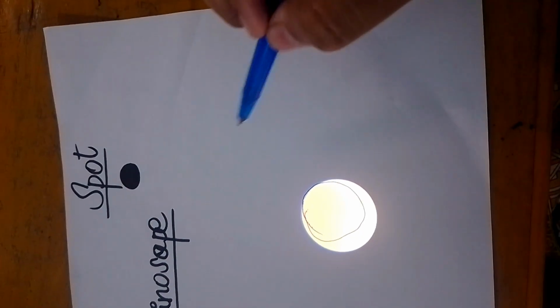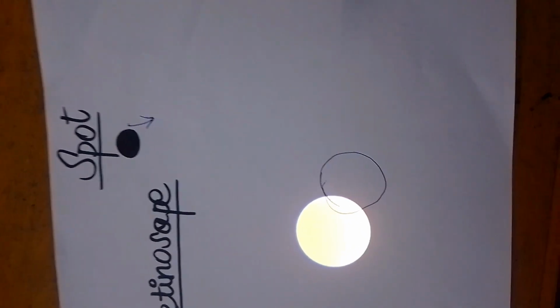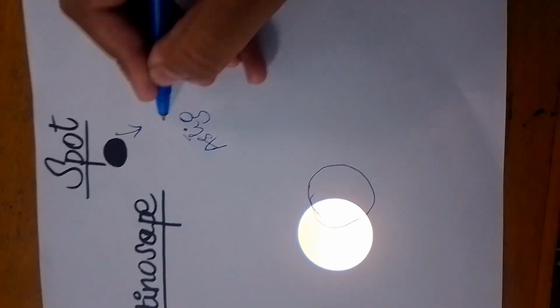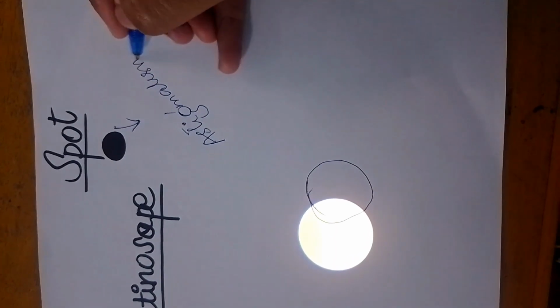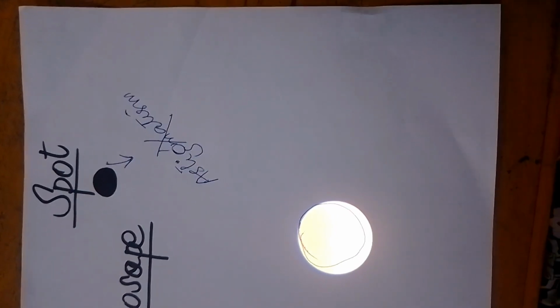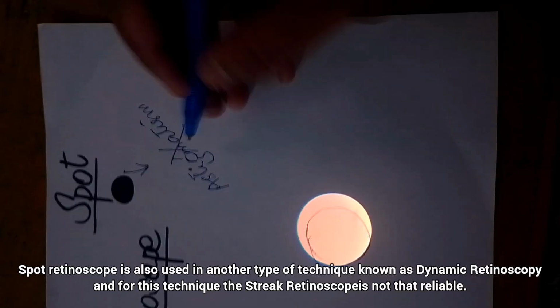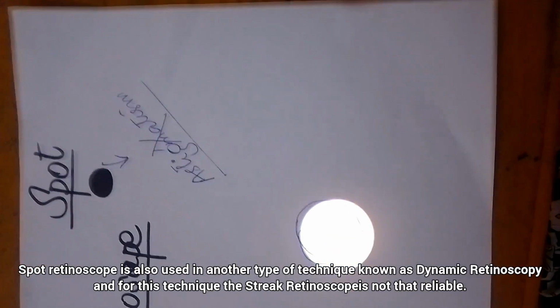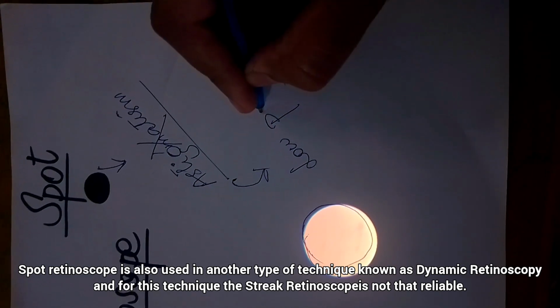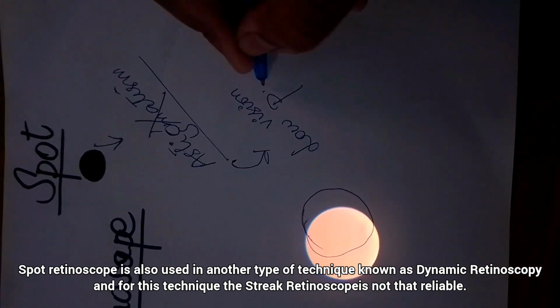So if one is performing spot retinoscopy, he is unable to identify the astigmatism in the patient's eye. That is why it is not used commonly in setups. Where it is used is in patients that have low vision.